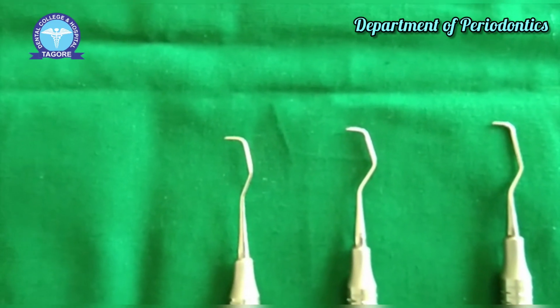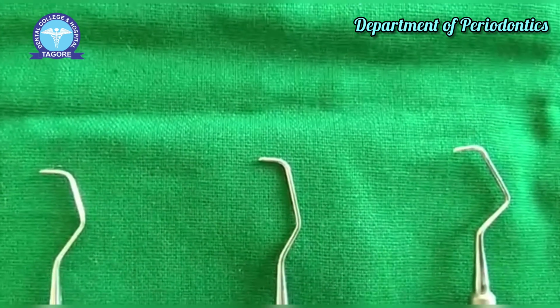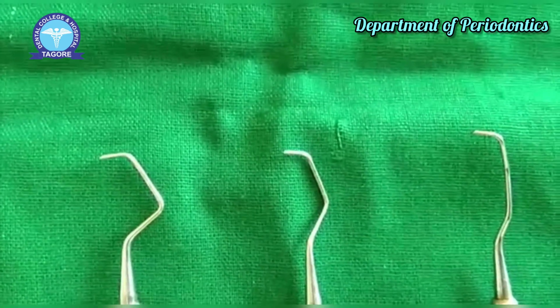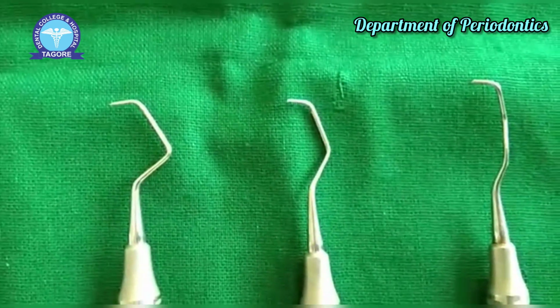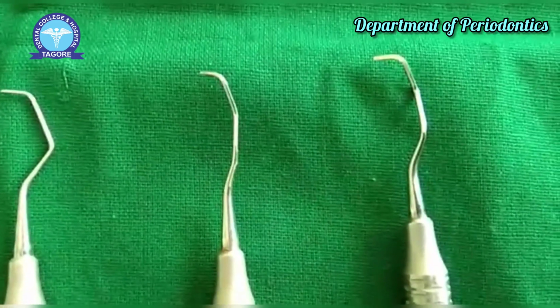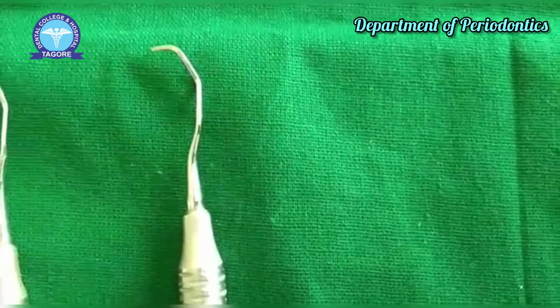5, 6 are used in the anteriors and premolars. 7, 8, 9, 10 are used in the molars, buccal and lingual surface. 11, 12 are used on the mesial surface of the molars. And 13, 14 are used on the distal surface of the molars.